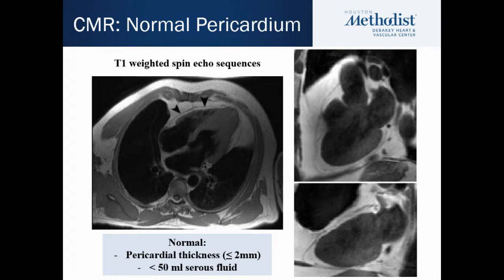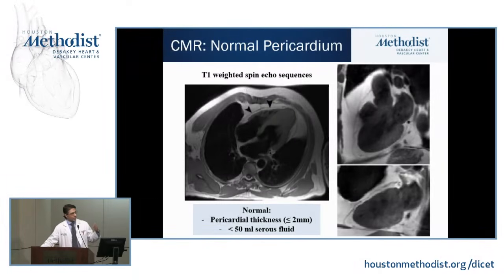What you'll notice is that you can really see it well, usually anterior to the RV, because that's where it's surrounded by fat, and you get that difference in tissue contrast. It can be particularly harder to see on the infralateral portion of the LV, because again, there's less fat present.